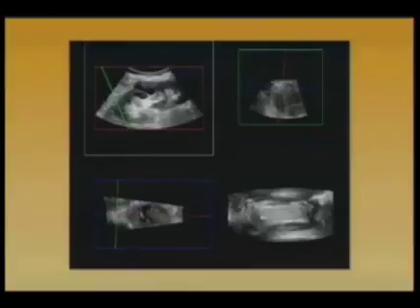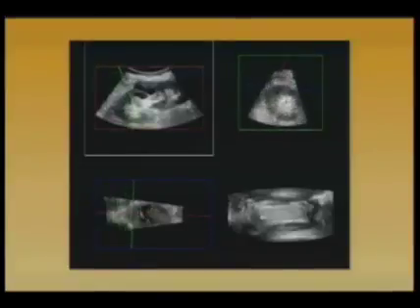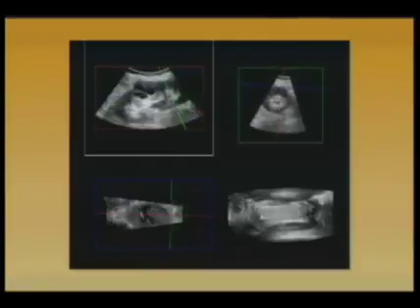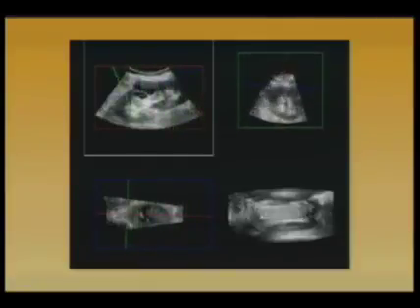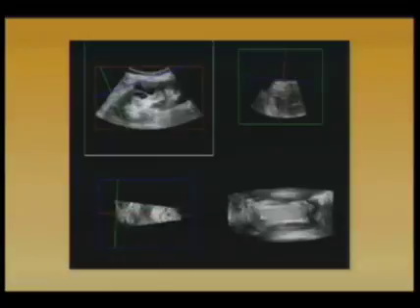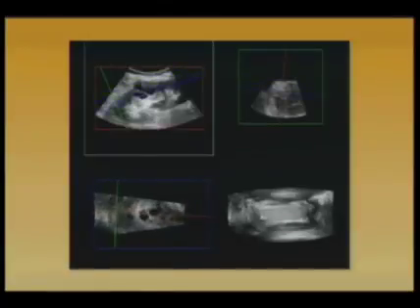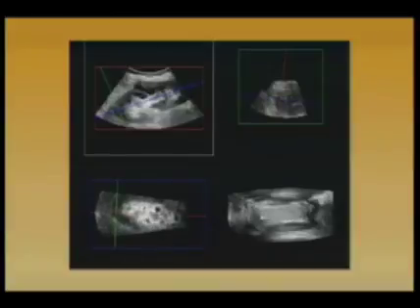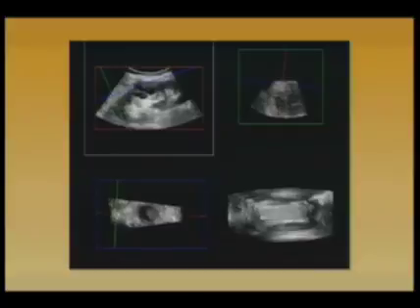And another example of a renal cyst, as I activate the clip and pan through, you can see the septations within the cyst quite clearly in the other two planes. And panning through in a different direction, looking at the C plane, which is again completely reconstructed by the software. It wasn't acquired directly by the transducer. We can see the complexity in that cyst from another perspective in the reconstructed multiplanar image.